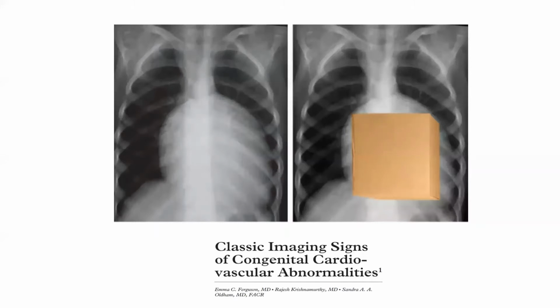Okay. So this is Ebstein anomaly. Again, there is severe RV dilatation and probably RA dilatation, so it gives this morphology. And you see here, the proximal part, which is occupied by the great vessels and the pulmonary artery, is a bit narrow because of reduced cardiac output and reduced flow across the pulmonary artery. That's why it gives the morphology of a large chamber with small great vessels. So it's kind of a box-shaped heart.